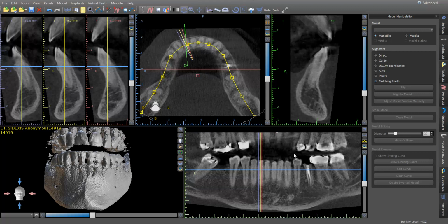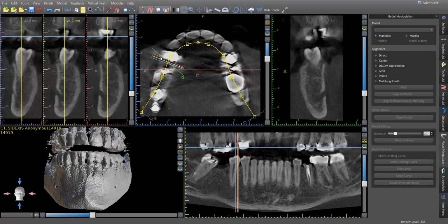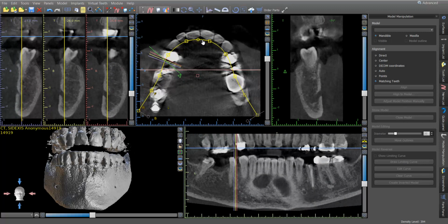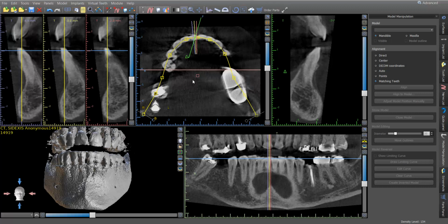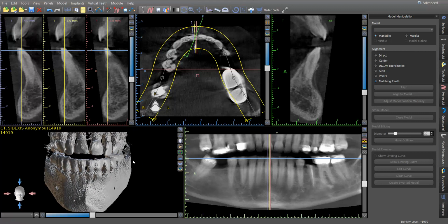Okay, this pan down here looks pretty good to me. It doesn't help with the upper teeth, but we're not working on the upper teeth. If I was, I would click here and then I would move the curve. Now, one thing you can do is you can grab this little circle here and you can drag it up. And then if I wanted, I could bring it up to here and then idealize some of these other points. But again, we're not going to be doing that. We're working on the lower teeth right now. So let's click down here. Let's bring these right in line. And I think we're looking pretty darn good. This, again, doesn't have to be perfect. Don't spend too much time, but there we go. So now that's mapped. You can see a good pan down here. And if I click this button again, it turns off that slice and I can see the whole PanRX generation. So, okay, that is the introduction of the DICOM, and the next step we will begin with mapping the nerve.